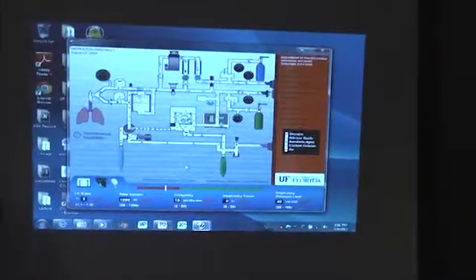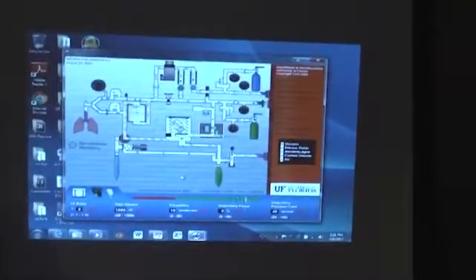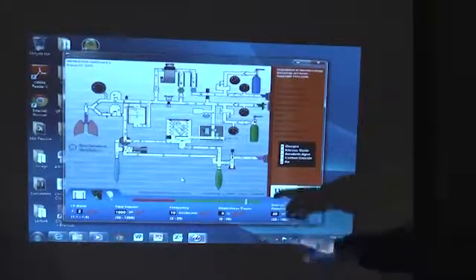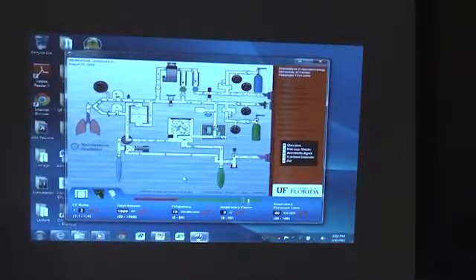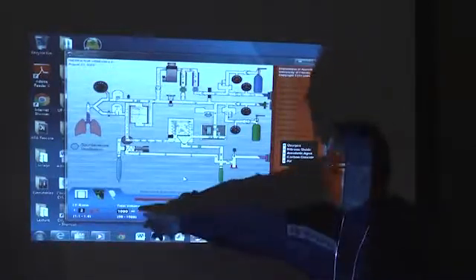So what is your consumption from the ventilator then? 1 liter? And you're giving that how many times a minute? How many times are you doing that? So then it's actually 10 liters? Very good. 10, yeah, 10 times a liter.